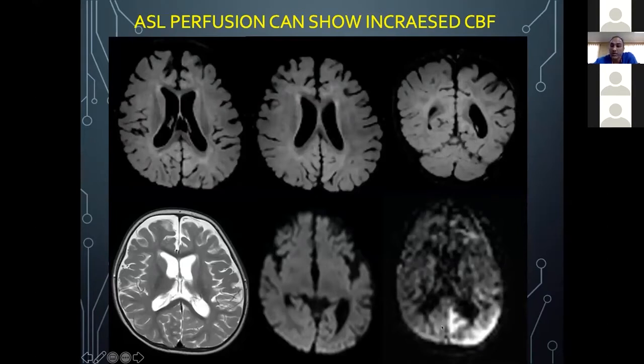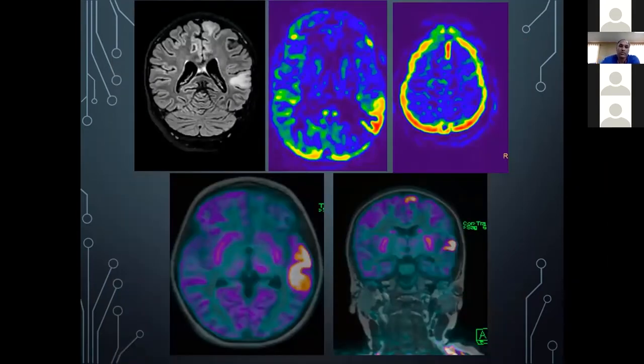But look at this on the perfusion scan, you can see there's hyperperfusion not only in this region, but also going into the occipital as well as into the parietal lobe. So this patient was having very high interictal spiking, and that was the reason why. So sometimes you can actually localize based on these kinds of additional methods. So we have to be judicious when we are using these methods because it takes time. Your exam times get prolonged.